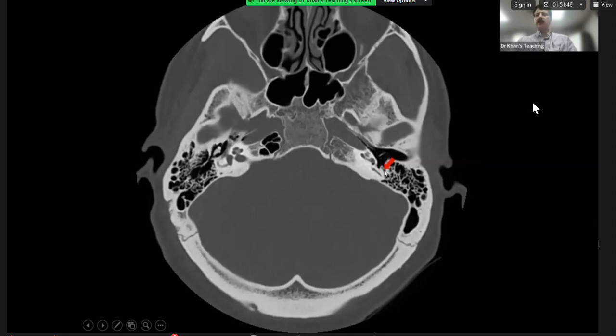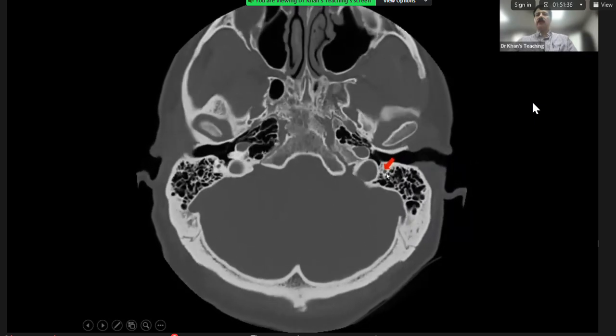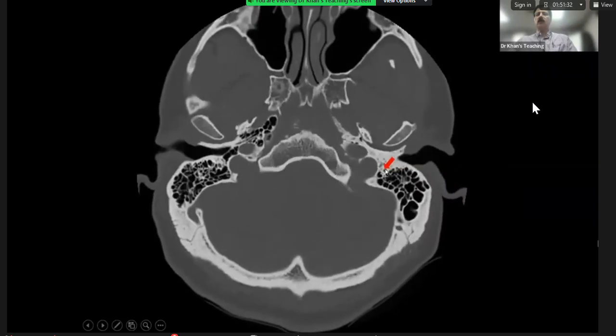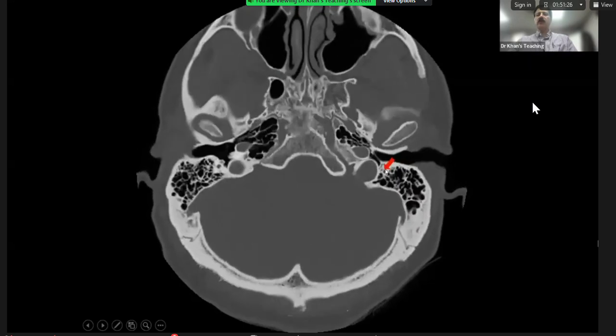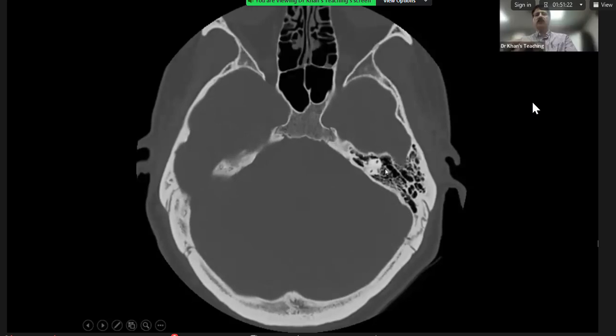If you see it very carefully, there is a dot here. So this is the stapedius muscle actually. And this thing is the descending portion, and it will go out. Another point to remember is that, okay, so what we do is that we go to the coronal section.